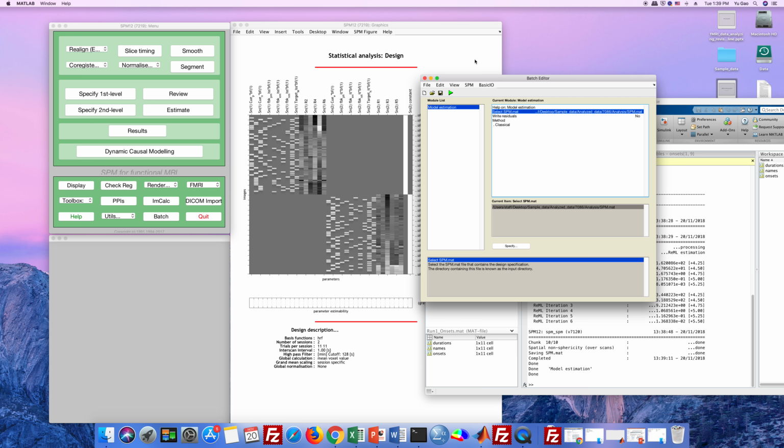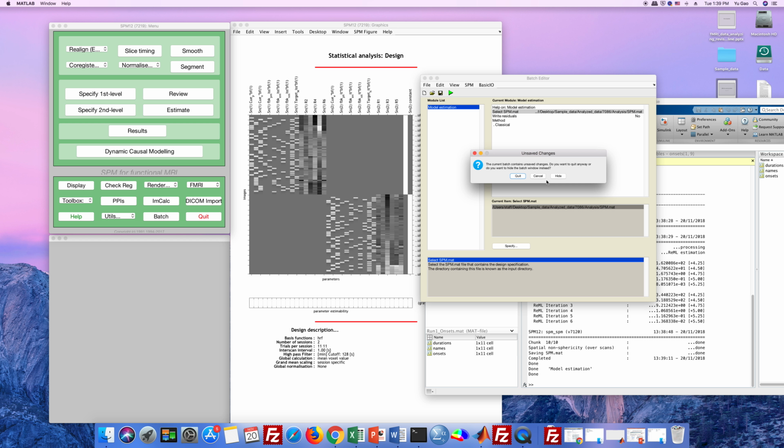The last step of the first level analysis is to define the contrast. Here we are interested in the activation under one condition, or the difference between conditions. So contrast is the planned comparison. We need to define which condition minus which condition, or which condition itself.